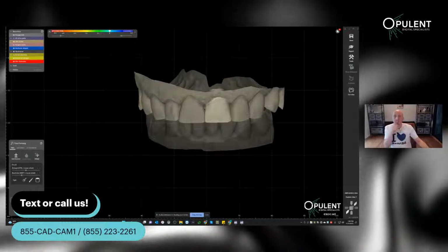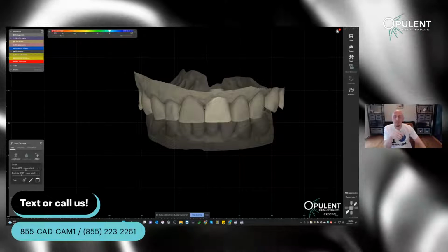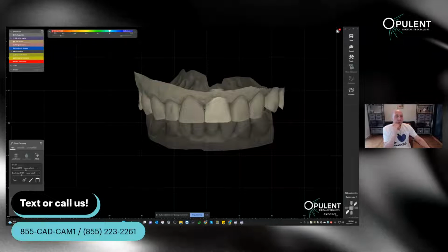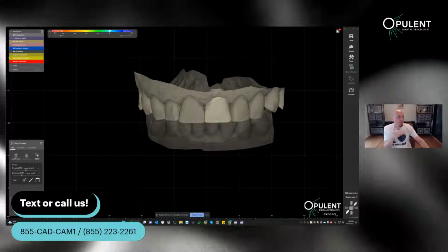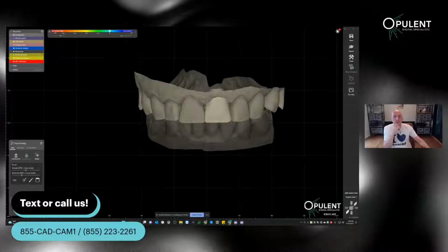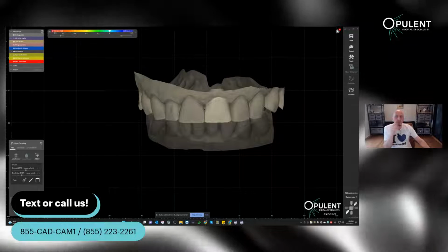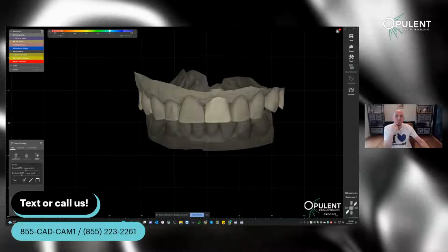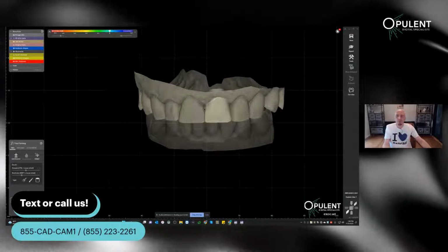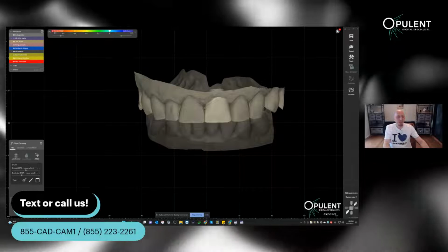By the way, I know there might be some folks watching from my group in North America. To my peeps who are using Ceramil, if you're seeing something in here that's not in your Ceramil version, there's usually a way of enabling that. So you can reach out to me. The Screwmentable, this manual positioning, is actually quite simple to enable. So if you struggle with any of that, preferably if you're in the US, just feel free to reach out.